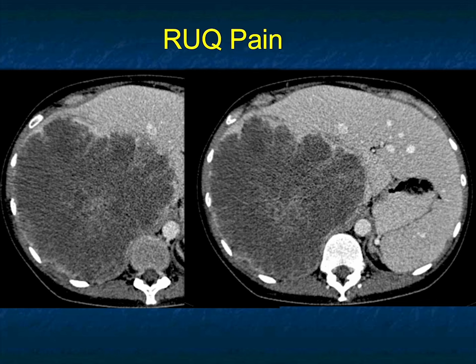This patient has right upper quadrant pain. Large mass in the liver. Could be hepatoma, could be necrotic metastasis, could be fibrolamellar, but usually it's not so cystic. Could it be an abscess? I guess so, but the periphery of the lesion is very sharp. Abscesses can be sharp sometimes, but there's usually perfusion changes. I tend to like a primary tumor of the liver. If I was pushed beyond hepatoma, beyond cholangio, beyond metastasis, I would think of some sarcoma.